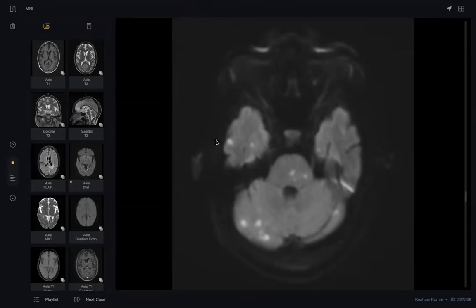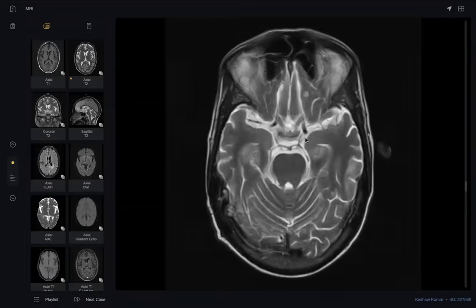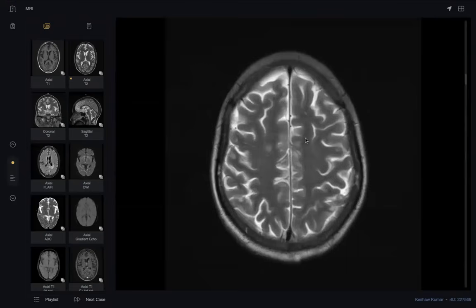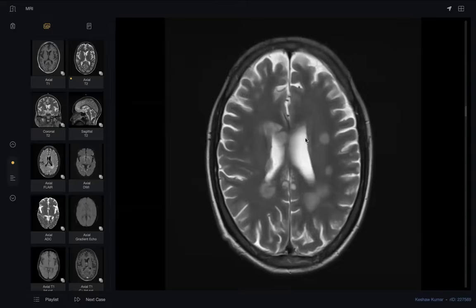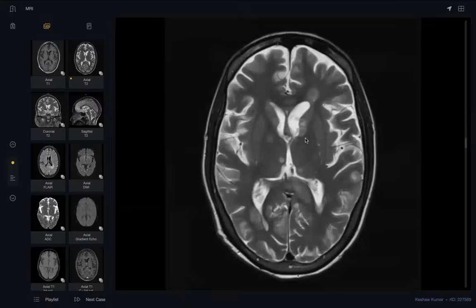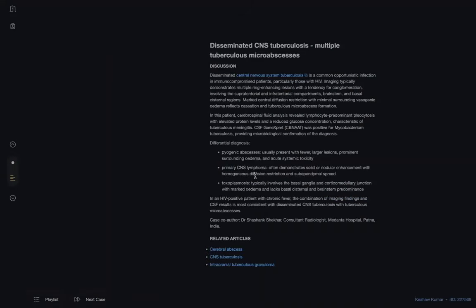What happened here, my colleagues: when you are presented with something widely spread like this, think about something horrible, especially in the brain. She did very well when she talked about metastasis. I'm talking about the first candidate. But the examiner asks, what else? What else means you should add more and more. What is your differential list?